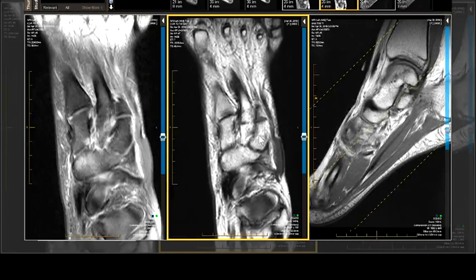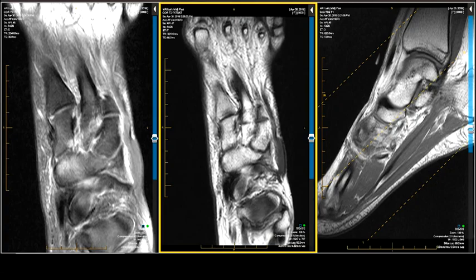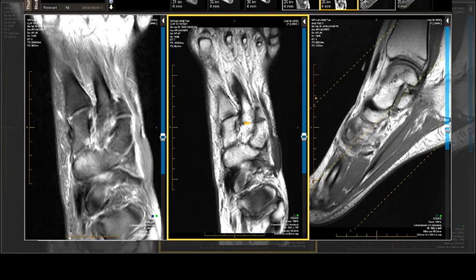Like to break down the foot into 3 columns. You've got column number 1, column number 2, and then column number 3 out here for the 4th and 5th. So 1, 2, and 3. Column number 2, the second, is recessed. So if you look at it, look how the second is recessed relative to the third and the first. Let me take my markers off. Recessed. Right there. So that's why fractures here in a midfoot torsion injury occur.